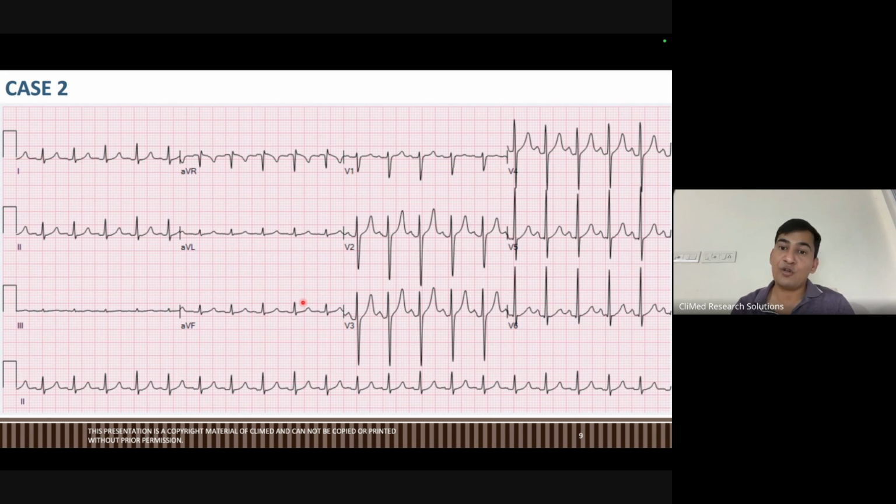Here I can confidently say it is following the QRS complex, T wave, P wave pattern, and I can say this is T, this is P. In the flutter I cannot, because there is no differentiation. This is a consistent normal ECG pattern.